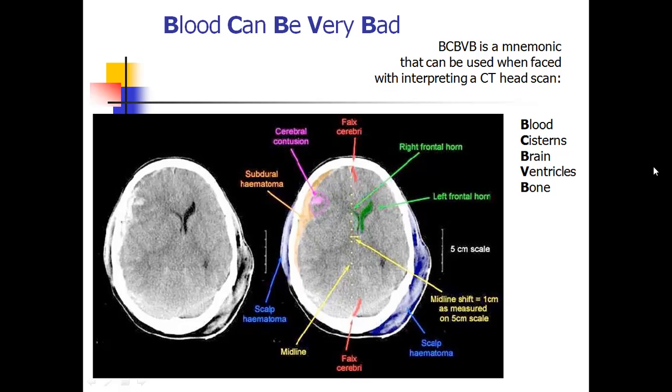This CT scan shows acute hematoma as well as an associated cerebral contusion or bruising. The true midline has been outlined by yellow dots, and you can see that the frontal horns of the lateral ventricles have been pushed over to the left. In addition, the third ventricle is now not visible, and it's also extremely difficult to make out the basal cisterns.